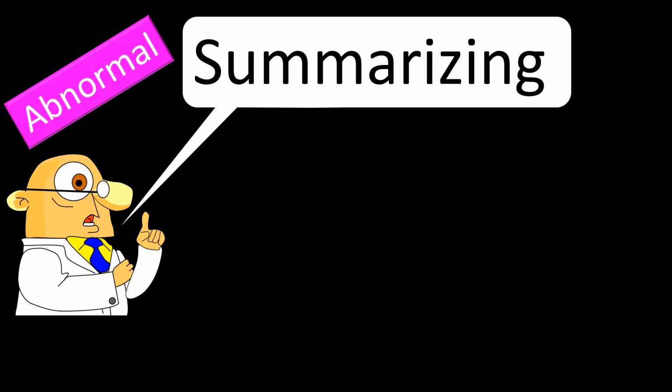From the data that I have presented to you, I am unable to reach a sound consensus as to how long an interburst interval should be. Yet, every time I read a neonatal EEG, I have to make a decision, so I use the following criteria.